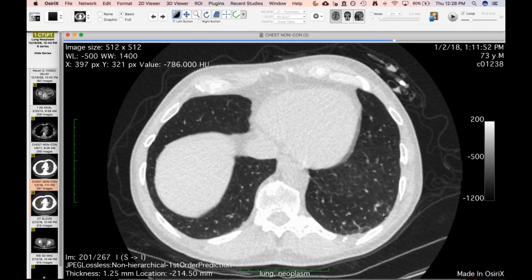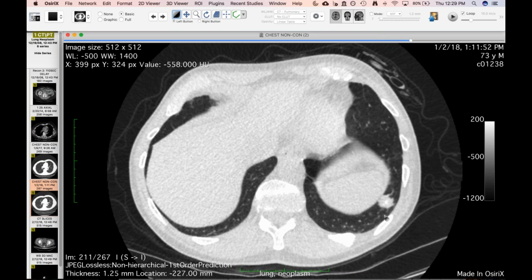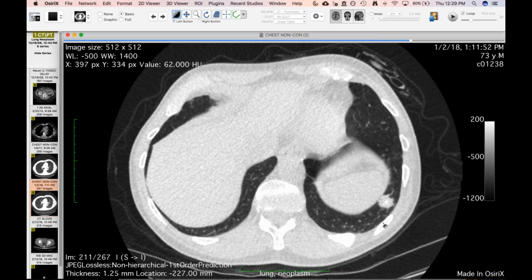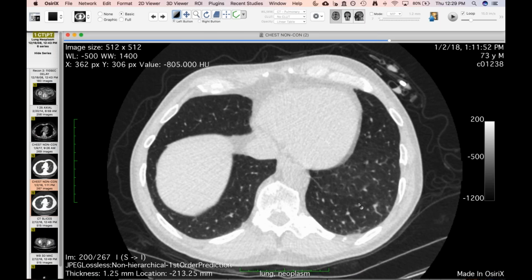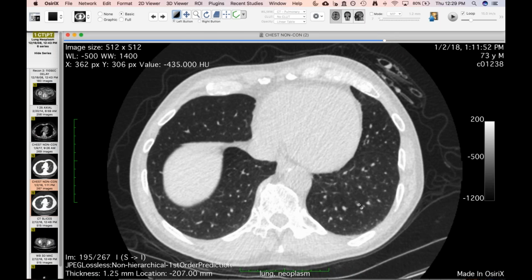But certainly not the typical look of amyloid that we see, even in the lungs. So I think the big amyloid nodules tend to be in the lower parts of the lung. They can have some emphysema around them, as Howard has emphasized too. So yeah, I think it's ossification probably. The calcium is probably bone.